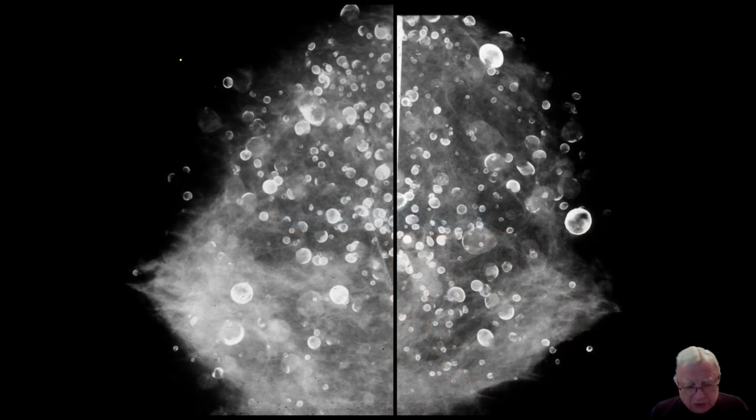After all this, I could ask you a question. What is this? And you would say, not within the ducts, not within the TDLUs. This is outside. And if you are foolish and don't think, then you say, oh, this is silicone. No, it's not. Please. Silicone is like a golf ball. There is no hole in it. No, this is traumatic fat necrosis.